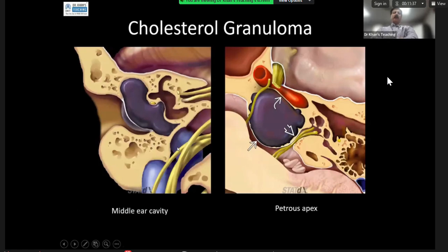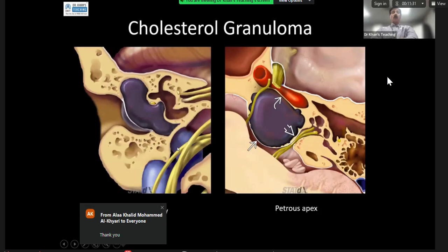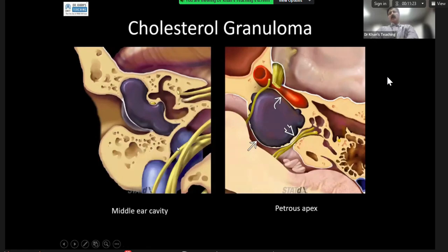Very chronic, and I read a study in literature way back where they had documented a cholesterol granuloma developing in 22 years, because they had serial imaging. Now, what happens is that it keeps bleeding within the lesion, and so part of the high signal is hemorrhage. Part of it is cholesterol crystals. That is the concept, and it will cause expansion. So it's a unique type of chronic inflammation. The radiology is Aunt Minnie radiology, and it will cause expansion.